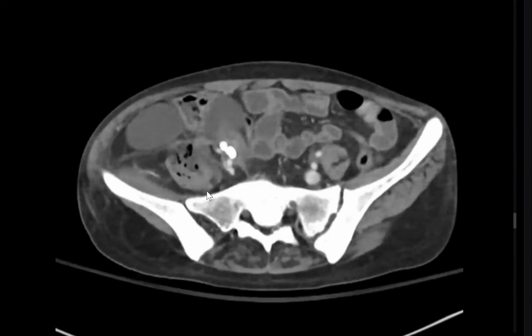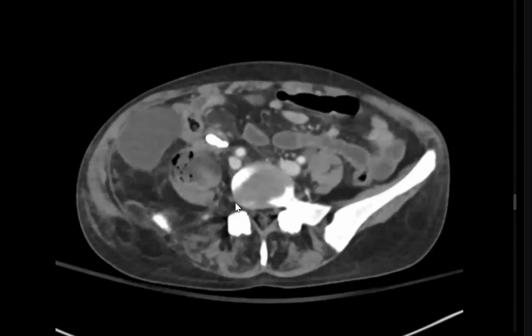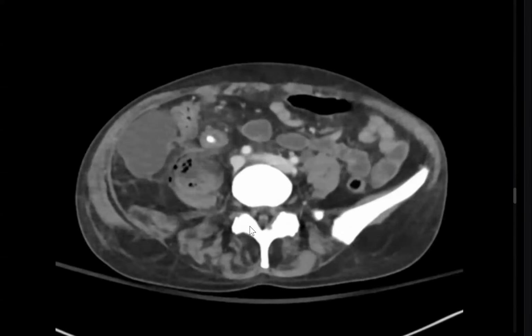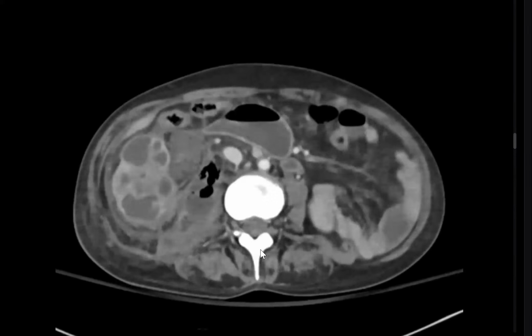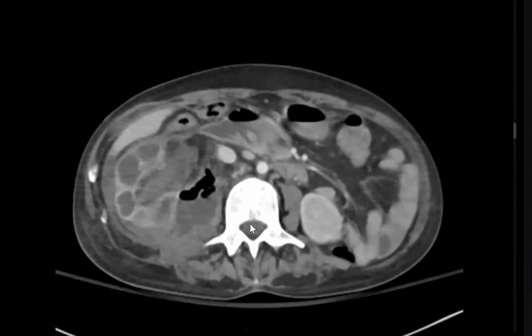There's a stone here. It's very long. History of neglected catheter. So there is infection on top of calcification around the ureteric catheter, also present in the urinary bladder. It's a calcified ureteric catheter. And of course, this is a urological emergency. What's your management?